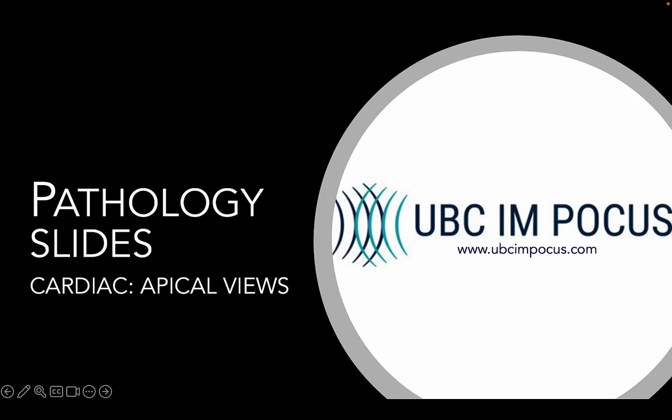All right, hi, it's Katie Wiskar from UBC IM POCUS. This is another pathology video. Today we're looking at cardiac views and specifically apical 4 and 5 chamber views and some pathology from these images.